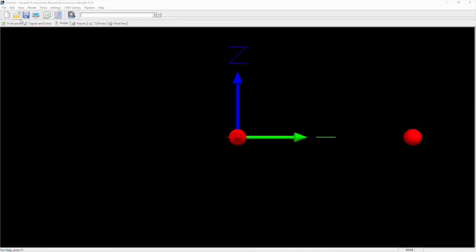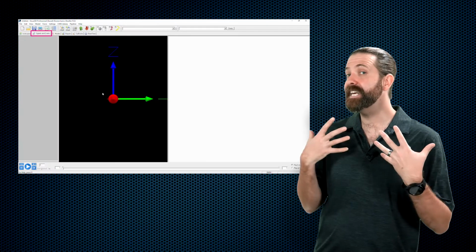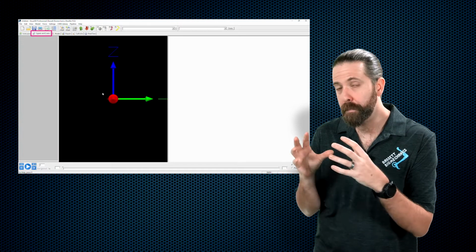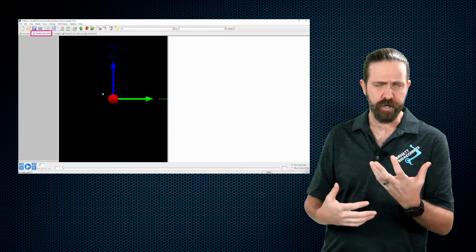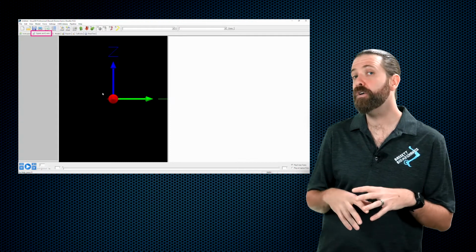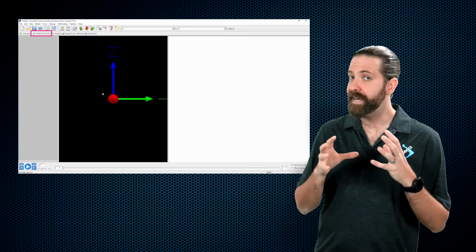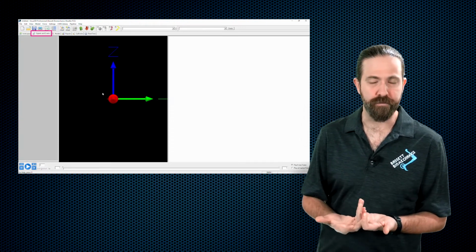So that once the biomechanical model has been defined, we can come over here and look at signals and events and see how that model built onto our motion files performs. And we'll be able to graph various types of data and look at it in detail. We will also, in this area, be able to view the calculations that we perform.